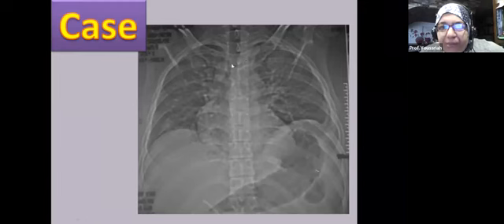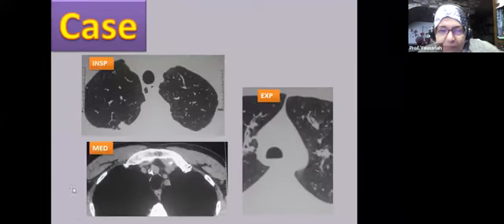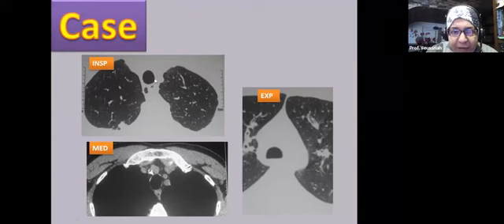Now the trachea. This is a scanogram. As you can see, it's a tubular lucency. It is very uniform in caliber. This is a MINIP image showing the very uniform caliber of this structure, the trachea, and its normal branching. Here we have axial images of the trachea. In inspiratory study, we have a cross-section which is oval or rounded, while in expiratory study, we have a flat posterior membrane. And this is a very important thing here is the mediastinal image.